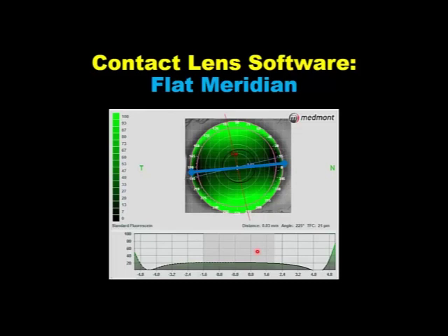So across this axis line, what we desire is a lens that clears the central cornea, lands at 9 o'clock, lands at 3 o'clock with a healthy edge lift on both sides. This means the lens should be laterally stable. It shouldn't move with the blink, either nasal or temporal. It's sitting on the rails right here and here, as you can see in the graph, and it should only move in the vertical meridian with the natural forces that exist, lid force and gravity.